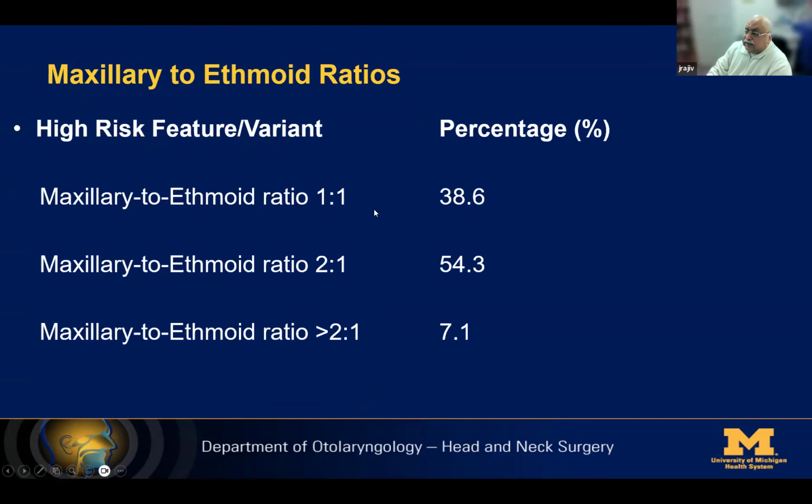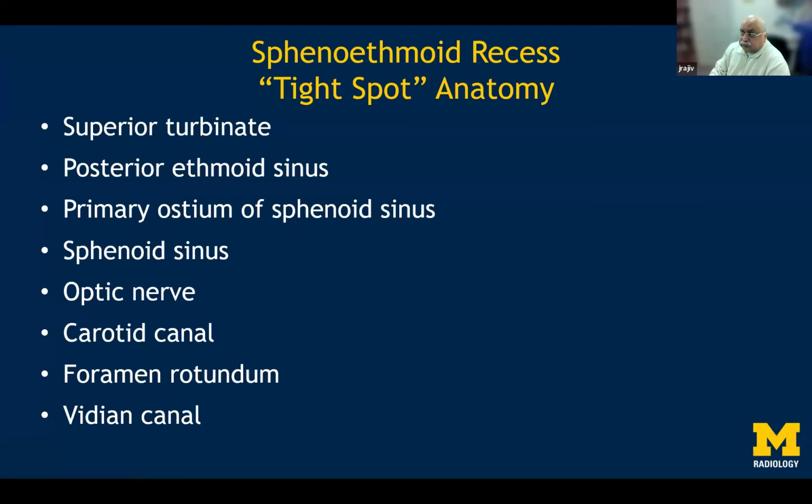The golden rule is that the more the ratio approaches 2:1, the higher the chances of injury to the ethmoidal structures and the anterior cranial fossa. So there is some sort of a unimodal distribution of the risks for injury to the floor of the anterior fossa because of that particular ratio, and it is frequently measured. And there are other variations for measurement of the ethmoid sinuses as well.